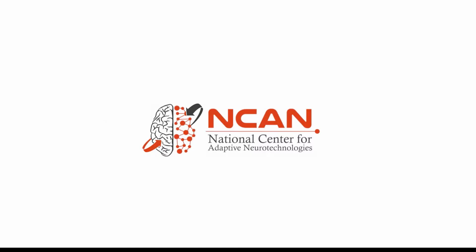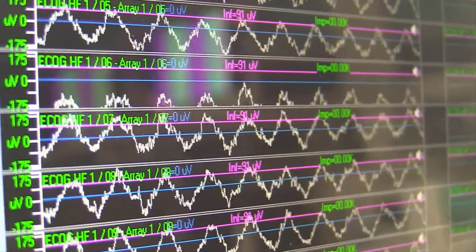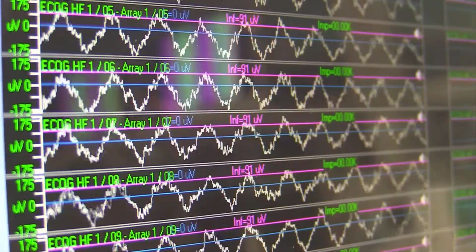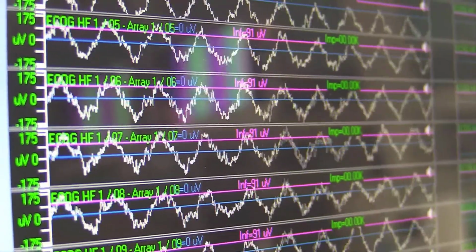Hello, and welcome to our tutorial video demonstrating the integration of the Neuro Omega neuromodulation system with BCI2000. In this video, we will discuss the benefits of using the Neuro Omega in your experiment, followed by a tutorial on implementing the neurostimulator with BCI2000.